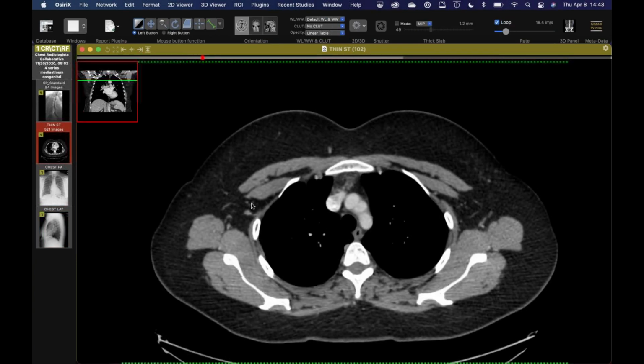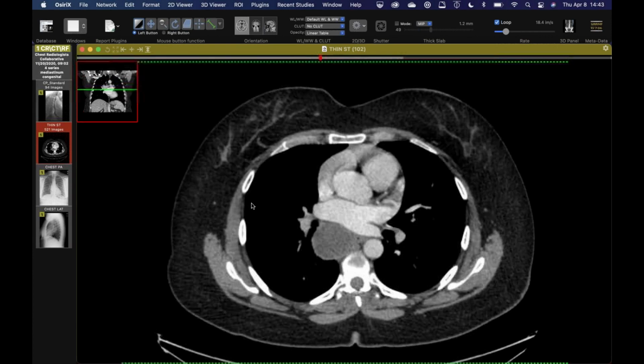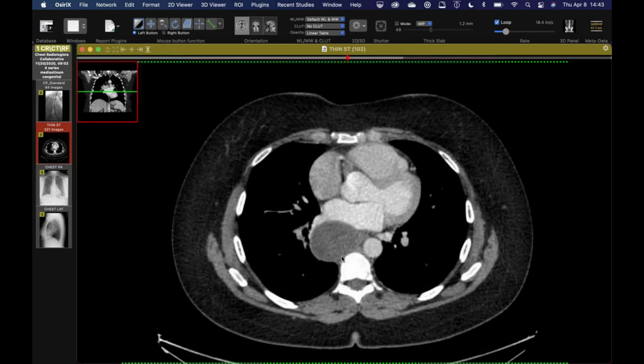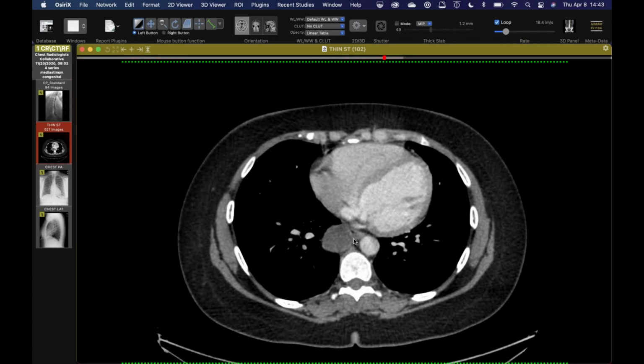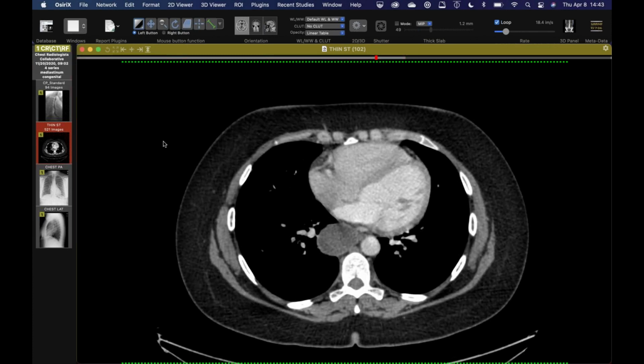I like to just call them foregut duplication cysts, because this case will illustrate they're not always bronchogenic. You can see it's got just a little bit of a capsule to it, but it's low attenuation. But it has some pretty pronounced mass effect on the esophagus right there, and it hugs it as it descends down there.